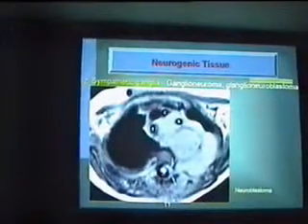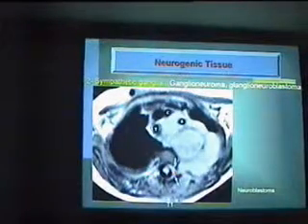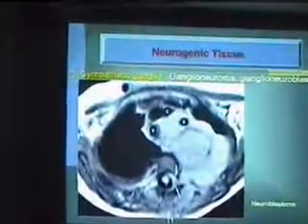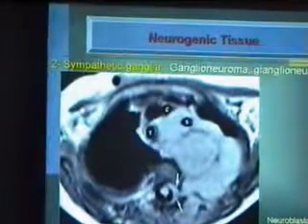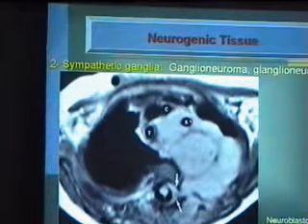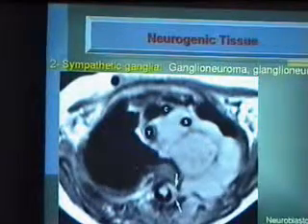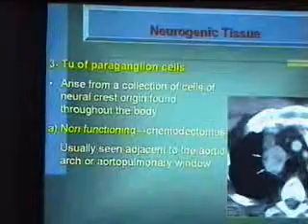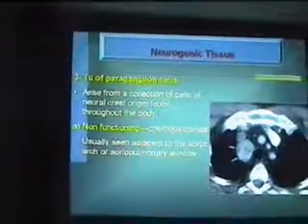And this is a case of neuroblastoma. Look at the mediastinal intraspinal component, the large lesion, okay? And this is the arch vessels. أهو احنا على MR, this is the trachea, and these are the arch, the carotid and subclavian, and the extension. And this was a case of neuroblastoma. يا ريت تشيل لو سمحت. شكرا.